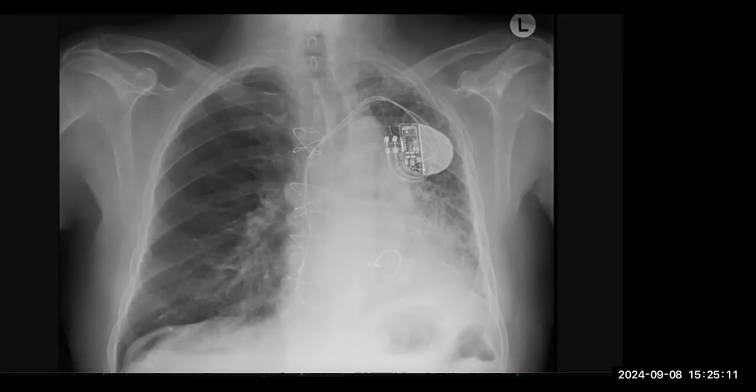And as for the lung pathology, I would correlate with the previous radiographs to see whether there has been a previous surgery done and what was the distribution of the disease previously. Was it unilateral from the beginning? In that case, I would think of some pathologies like maybe a Swyer-James syndrome with superimposed infection that could have led to such finding, or could be aspiration changes or some post-traumatic changes that could have led to this finding.